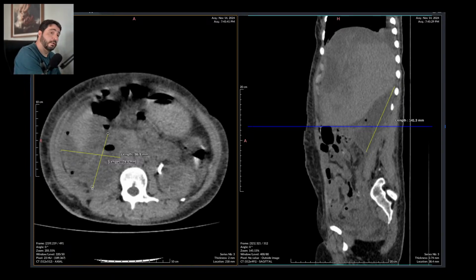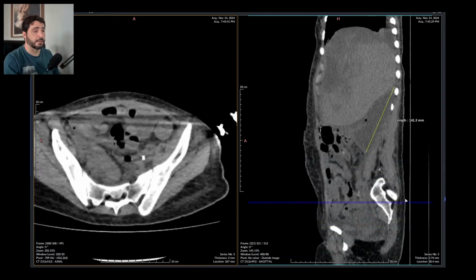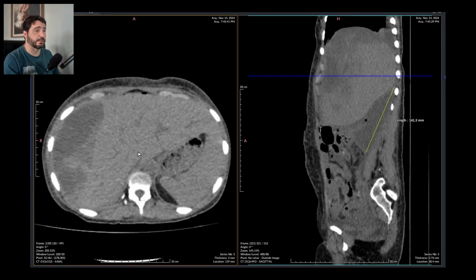Unfortunately, I've seen thousands of cases such as this all over the country. This is what they do to patients that really need proper assistance, unfortunately. Let's just report it as quickly and as objectively as we can.